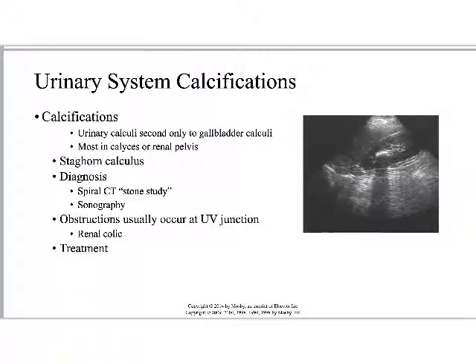But this is clearly showing a kidney stone. And the nice thing about it is you can see the shadow being cast by the stone, this shadow here. My understanding is the way that these pictures function is you have the transducer right here that's producing the sound waves, and what it's picking up is the echoes back. So it can tell that this is forming an echo signal. This is definitely forming a really strong echo signal, echoing back towards the transducer. And then we start to fall off.